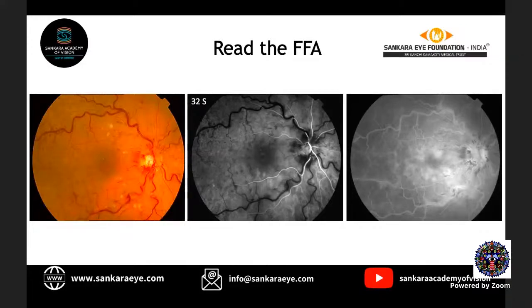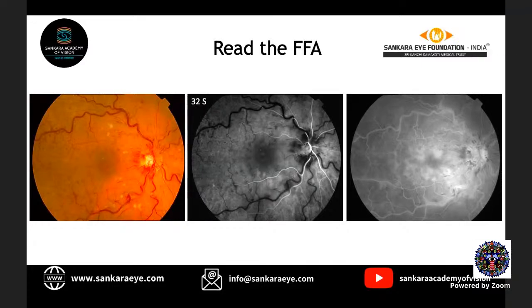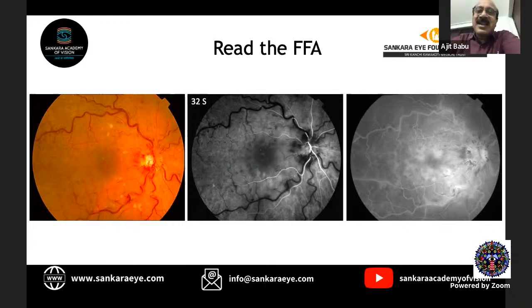By that time, recirculation will start. So what phase is this angiogram showing? Sir, washout? That is the late phase. But the middle one he has written 32 seconds, right?